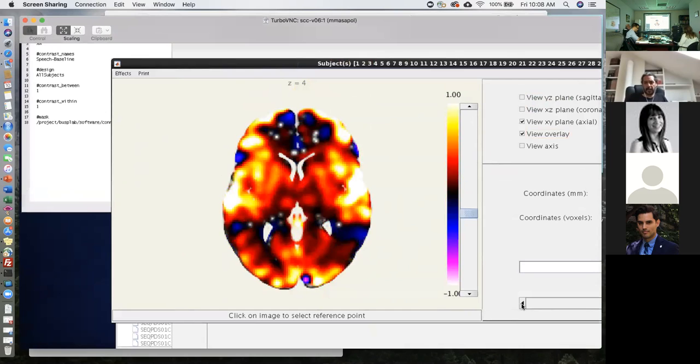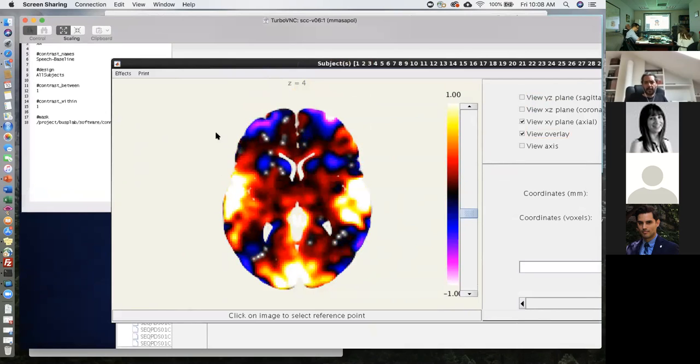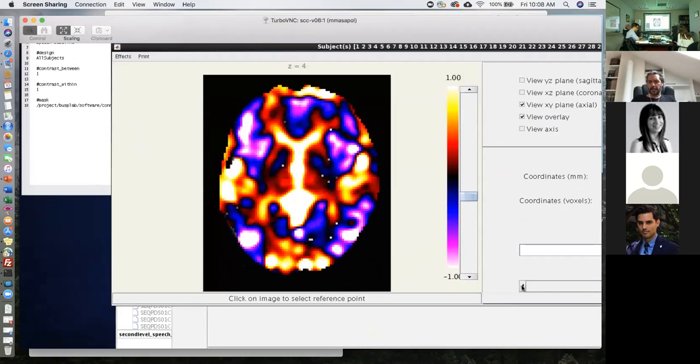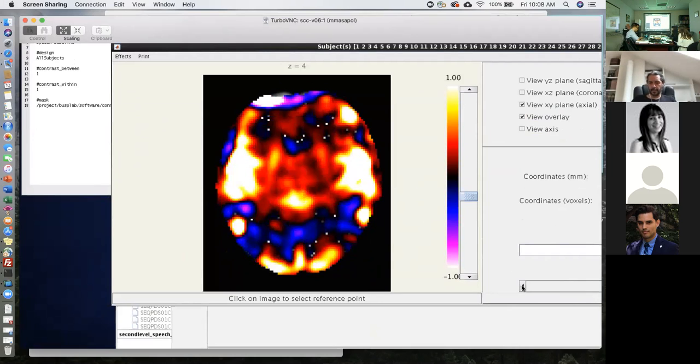And sometimes it over. Well, in this case, you need to click the raw, because otherwise the regions that are shown there. So select raw, and now increase the threshold just to remove regions that, so we should be able to see it in there. So right now we don't see it. What would we need to do to see it?